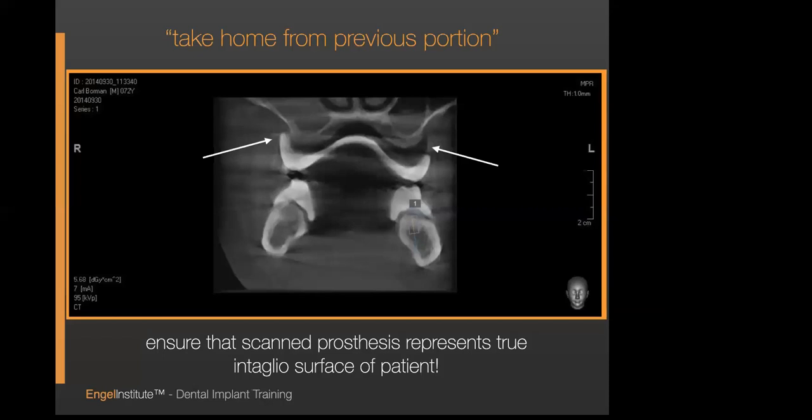There are a lot of great tips on how to take a really clean scan, such as this. Well, this isn't clean, but I think you know what I mean, on the 3DDX website. Again, there's a library of stuff. It's imperative that we know how to keep soft tissue away from the skull. It's also imperative that we keep the tongue away from the teeth. There's a lot of things that we can do that can really help our scan.